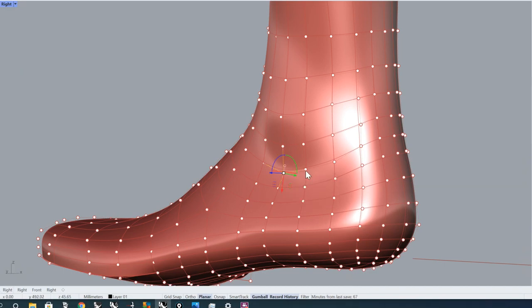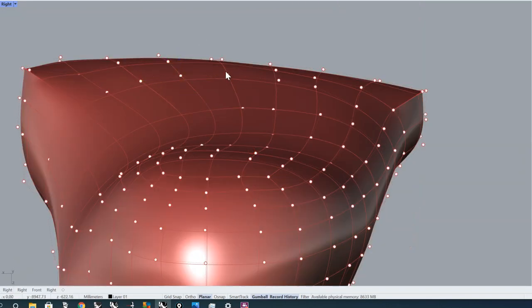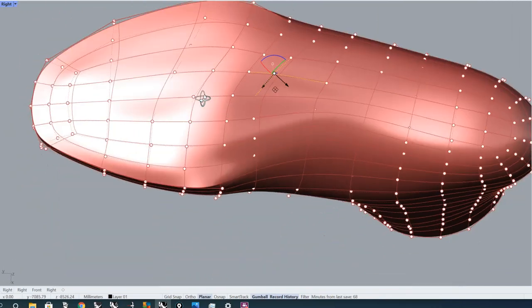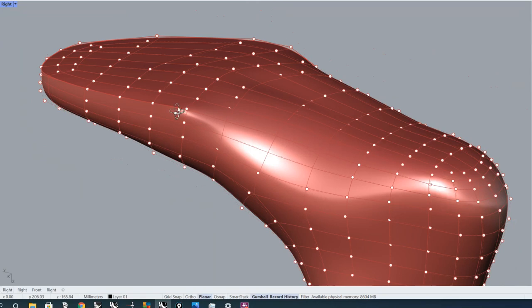I want some extra space here underneath the ankle. I know it can hurt there, a bit less curved. I can make a bit of support here behind the ball. It's called a retrocapital support. I don't like it there exactly.